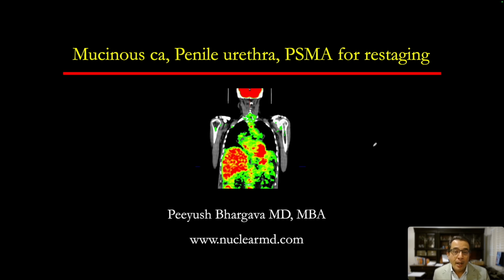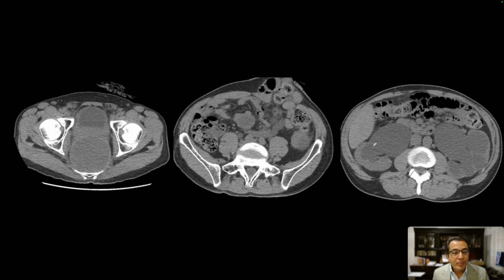In this short video, I have several interesting cases to share with you. We have a mucinous rectal cancer, we have stasis of PSMA in penile urethra, and we have PSMA for restaging prostate cancer. Let's get started.